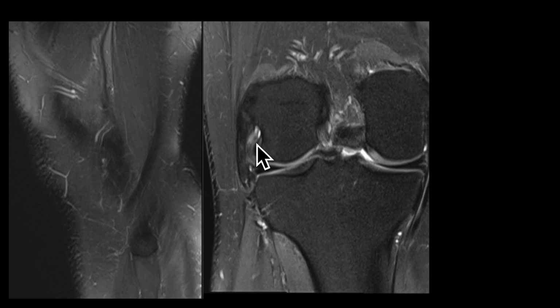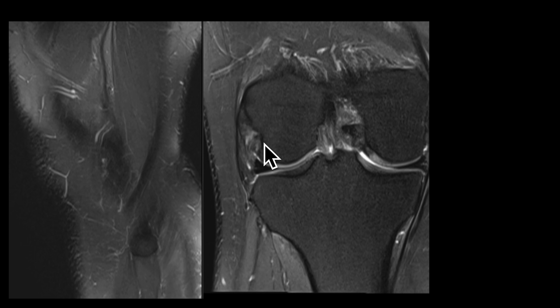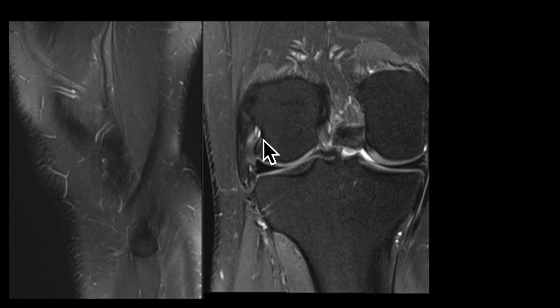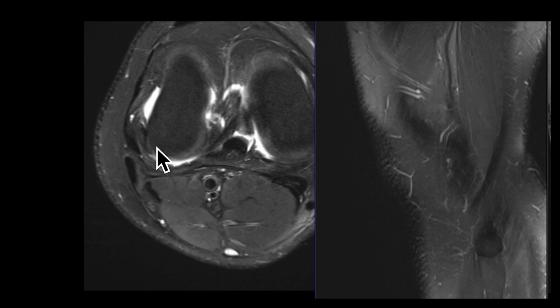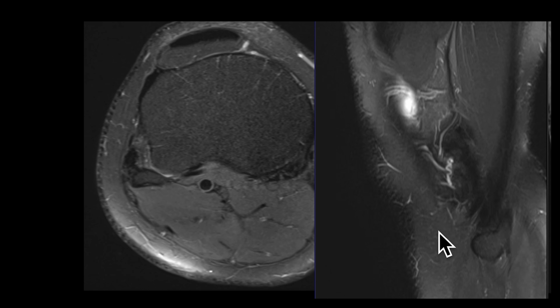You can see that this tendon looks different to all the other structures I've shown you here. There's this area here which looks of high signal intensity, and you might wonder if that is a tear. But I just want you to appreciate that this is a curved structure, so it's curving around the posterior aspect of the knee in relation to the magnetic field. So here's another example of that magic angle artifact that I mentioned to you. And the popliteal tendon can be challenging because you do see that magic angle artifact on most planes of imaging, just because of its orientation as a curved structure in all three planes.